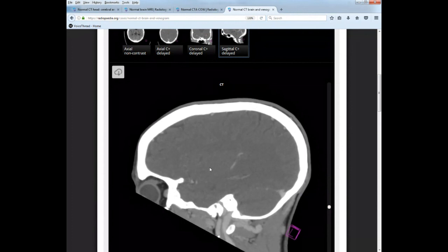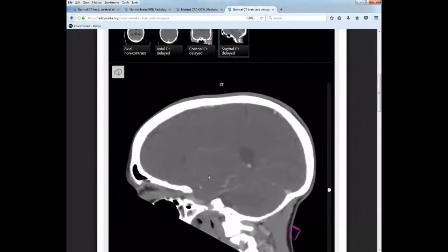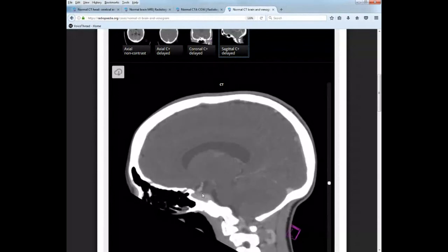And then inside in here, cavernous sinus right here. That's all you need to know as far as that goes. Make sure that you took really good notes as far as what anatomy you need to know in what plane as far as the exam is concerned, because you're not going to have to know all of them in all planes. Go back and listen to this again so that you know exactly what you need to know in what plane, so you're not over studying.